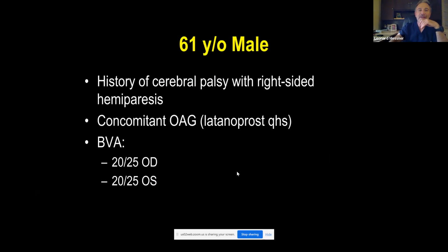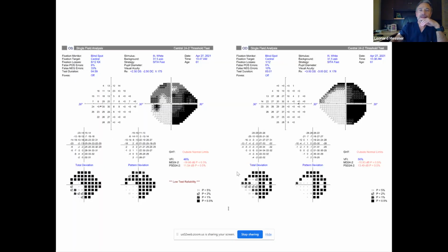Now, I talked to you about that. I said, beware of your glaucoma patients that present that way to you. Here's a 61-year-old man that has been treated within our glaucoma service who came in with these visual fields, meaning that he's got a left arcuate bundle defect superiorly in the left eye. Can't really see what's coming off the optic nerve in the right eye, but you can see that there is something of an arcuate bundle defect that is affecting his nasal field.